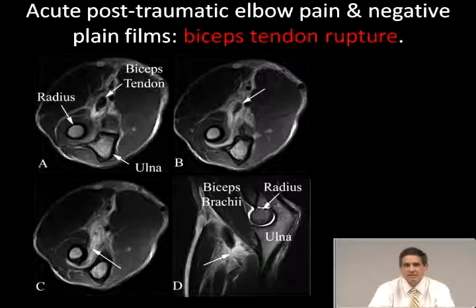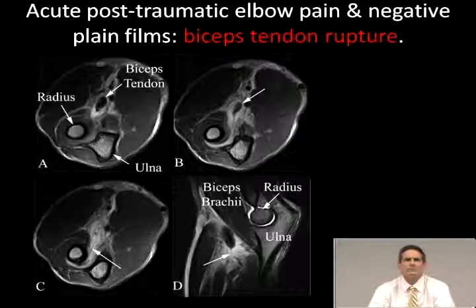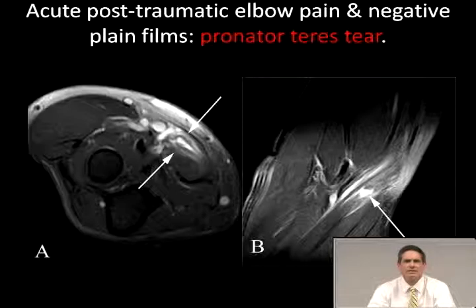It's not a life-threatening thing to have a torn biceps tendon. A lot of people walk around with one. You can get it repaired for either cosmetic or functional reasons, although surprisingly you don't lose a whole bunch of power for biceps curls after losing the biceps. There's still a brachialis muscle after all. Anyway, in the interest of thoroughness, and because this was an interesting case, I threw it in here.